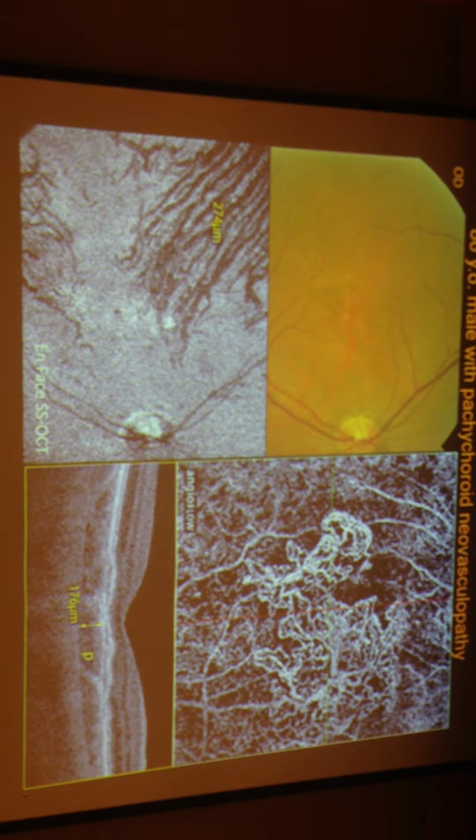Oh, you mean the network? The network looks like a BVN. Yes, that's true. The network looks like a type 1 choroidal neovascularization and is similar to a BVN. So how you differentiate it from polypoidal is you have to use multimodal imaging, by doing the ICG to look for any hotspots or polyps. Also, when you do the OCT, you can look for any polypoidal lesions on the OCT as well.